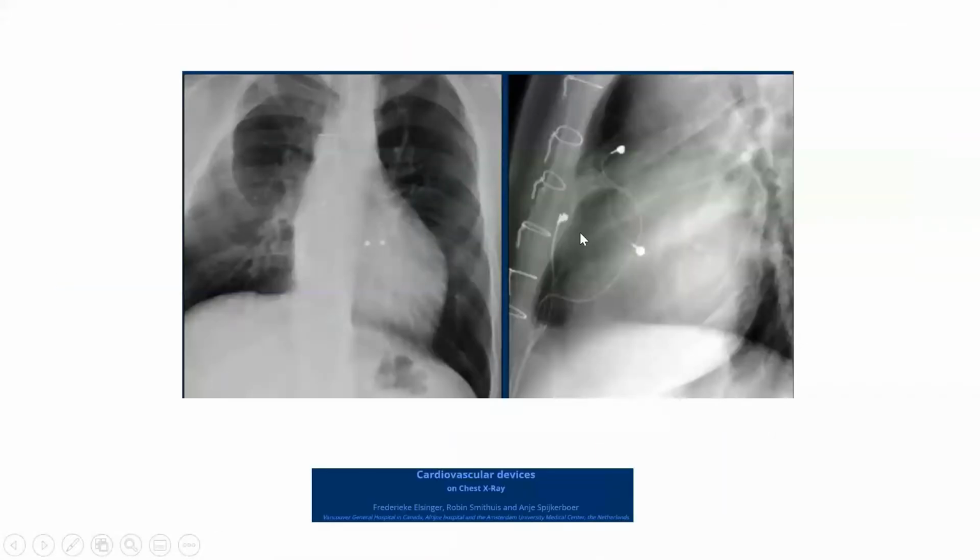And what is this? Epicardial. Very good. Iman, thank you. Yes, this is an epicardial pacemaker. The epicardial pacing wire is put in surgically. If during cardiac surgery they put it in case they need it, they stitch it to the pericardium and keep it. Sometimes they keep it, sometimes by simple traction they remove it after surgery if they don't need it anymore.